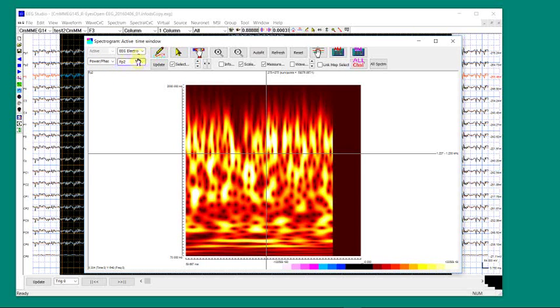You may wonder if we can compute all those channels. Yes, here we have a group. As you can see, beside each electrode we have a group. That means all the sensors. This is group mean, the combination of all channels, or we call it the global power, global mean.